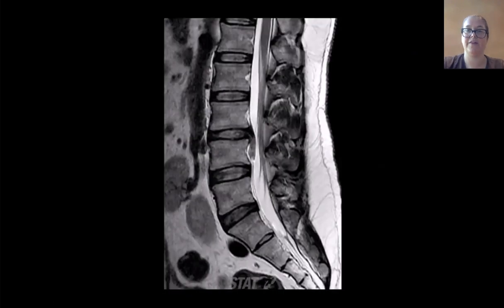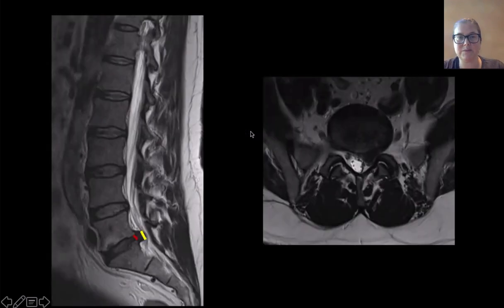All right, I think we would all argue extrusion here, or not? Anybody want to go against the grain? So if you look again at the parent disc contact, I think, I even don't measure it in the next one, it's definitely narrower than the widest point of the disc on any plane. Disc extrusion. And that last one, again, I will look into it, guys, and see if I can find a better consensus. But to me, based on the paper, it would be extrusion.